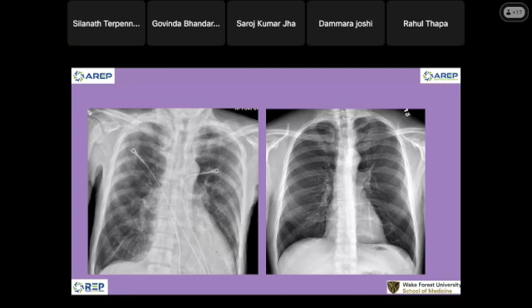What can cause diffuse sclerosis of osseous structures? The heart looks big or not? The heart looks okay, not something big. Okay, because all the bones are affected, we're not going to pay attention to the heart or the lung. We already talked about the pleural effusion, and the bone, including the spine. We already talked about it.